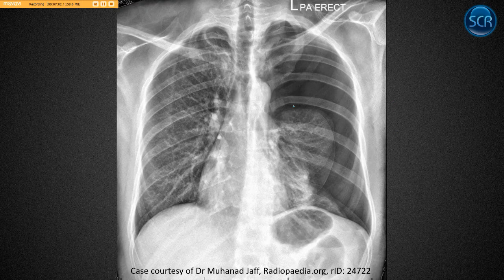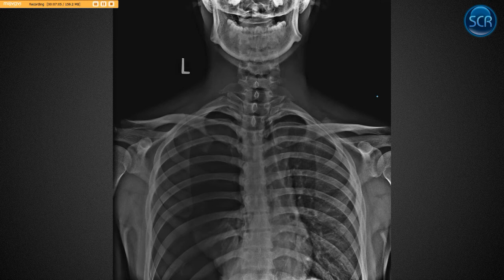And so you might think that this isn't going to walk in your office and this is not going to show up on boards, but this is a case that a chiro took because a guy had 10 days of upper back pain and he was stretching, not getting better. You can see he's got some hyperplastic transverse processes here. And we look at our lung apex like we talked about with our Pancoast tumor, and this one looks pretty normal. You see some arborization, lung stuff up here, but this one's empty, right? So this person's entire right lung is here. And you can see that lateral displacement of the heart pushing it away. So this person has a massive pneumothorax, right? This whole thoracic cavity is empty.